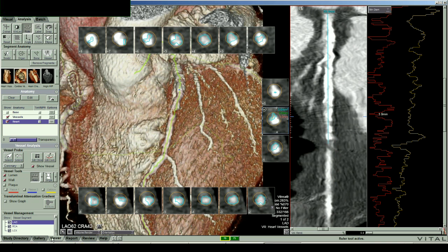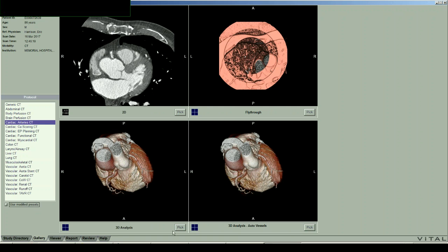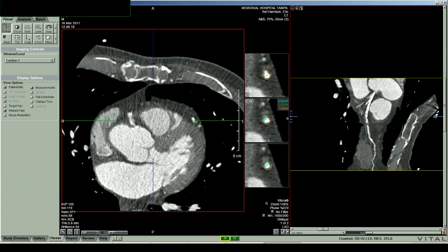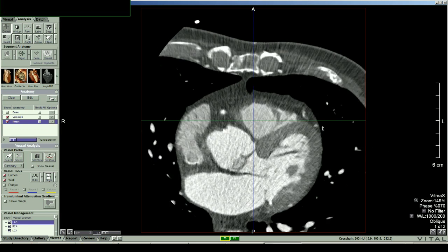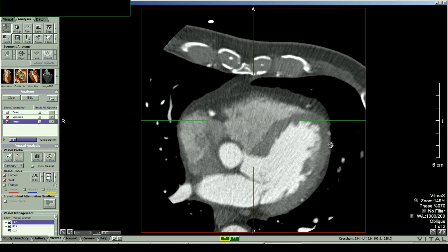And so let's look at the myocardium and see if there's any damage to the heart muscle. If we've got an occluded vessel, we need to look for damage. So let's go back here to the gallery, come back over here, and select an image, and then we'll anonymize this. And this is our image. And we're looking at the myocardium to see if we see any fatty replacement.